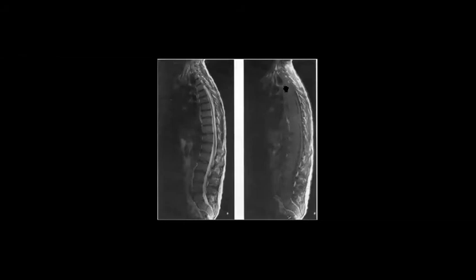So low signal in the bone marrow, which is less than the disk space or the disk. If you check the disk and you check the marrow, you will find that the signal of the marrow is less than the signal in the disk. So decreased signal also in the MRI. Maybe you can say signal intensity better, and I agree with you. So there is the reverse of the normal marrow. And most important to mention, the disk spaces are preserved.